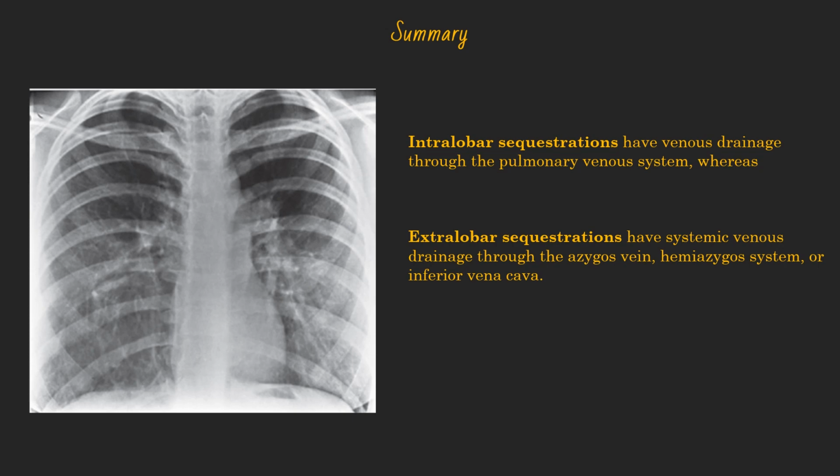On conventional radiographs, pulmonary sequestration can have a wide spectrum of imaging findings, including a solid mass, a cystic lesion, and an air fluid level, which can be confused with pneumonia, abscess, cyst, and tumor.